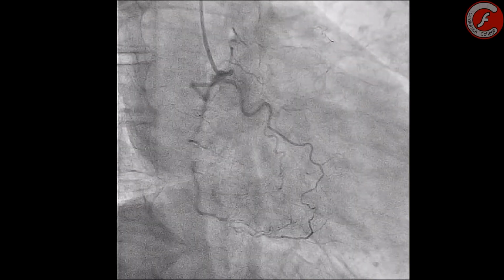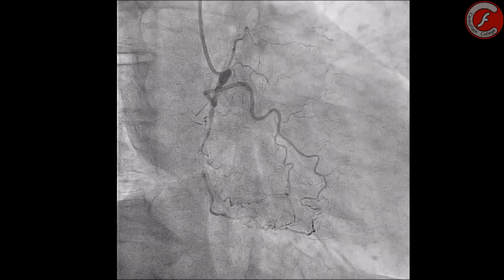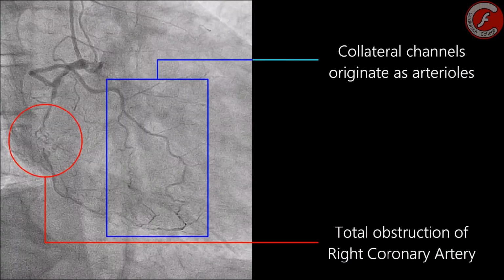This on the screen is a coronary chronic total occlusion, one of the most complex scenarios of interventional cardiology. Thereby, a chronic occlusion can be defined as a complete interruption of the antegrade coronary flow due to an atheroma plaque that occupies the totality of the vascular lumen during 3 months of evolution at least.